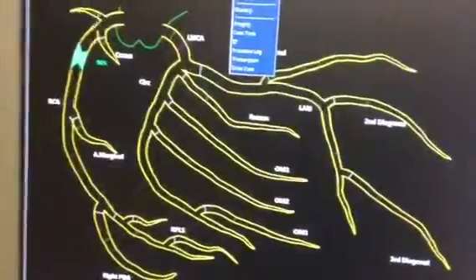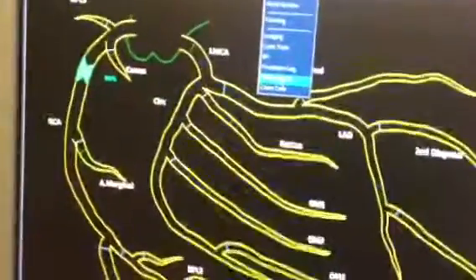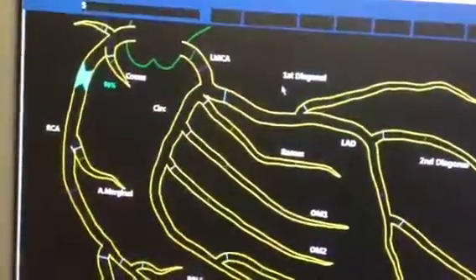He'll click hemodynamics, bring it down to the word transcription, and nothing will be there. You have to go to the transcription block. Even if something is there, go to the transcription block, pull down, and pick the one that says, make sure this clears up, there's one that says diagnostic and/or intervention, and below that it says intervention pre-referral.